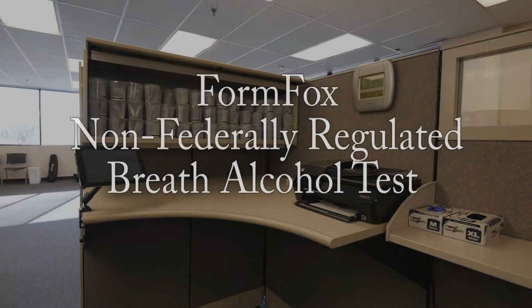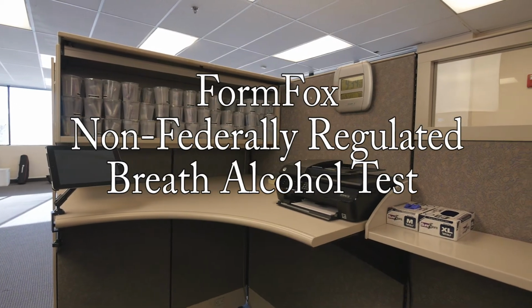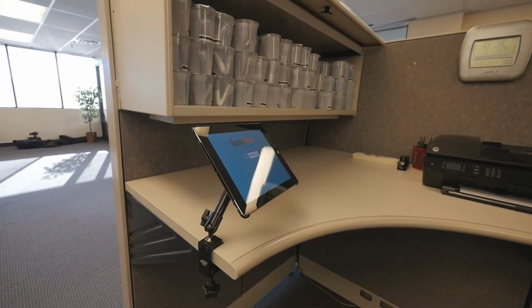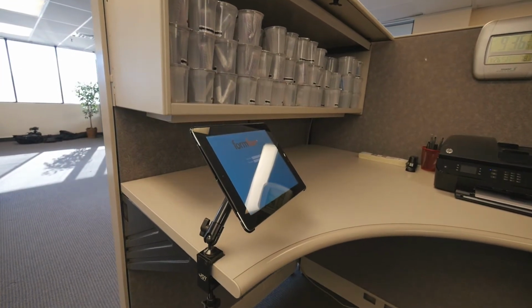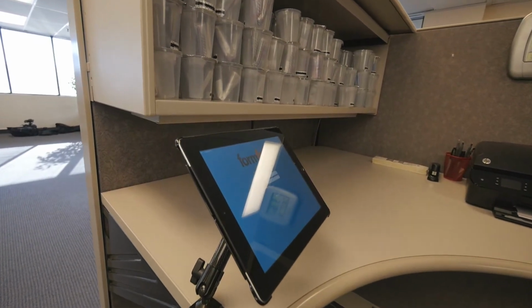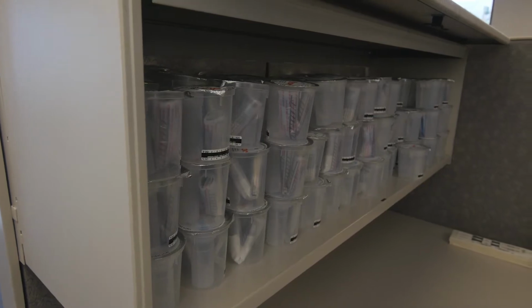Welcome to the FormFox Breath Alcohol Test User Training module. This training is designed to help users understand the basics of using FormFox for a non-DOT breath alcohol test with the FormFox system and assumes the user has some working knowledge of the testing process.